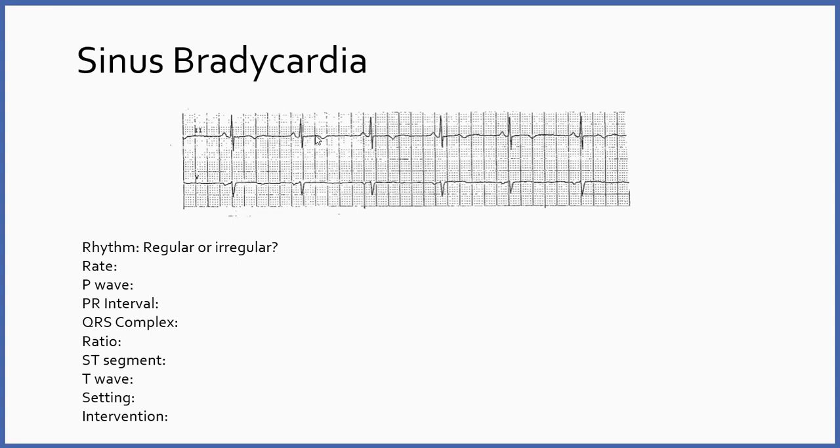Now I'm going to find the T waves, and as you're looking at them, you may notice that, as I pointed out before, they're not upright and rounded, they're inverted. That's not a normal configuration, but you know, they're T waves. You also notice in the V lead, we really can't even discern T waves at all. But go back up to lead 2, put me on pause, and measure the QT interval, and then come back.